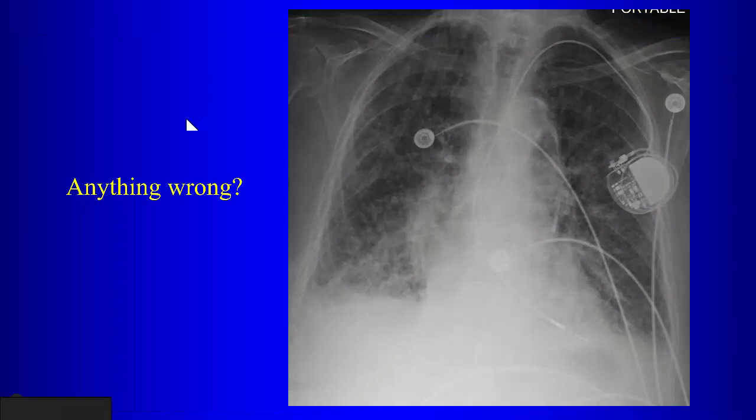So here's a patient who has a pacemaker. Anything wrong with this? Pacemaker itself, is it?